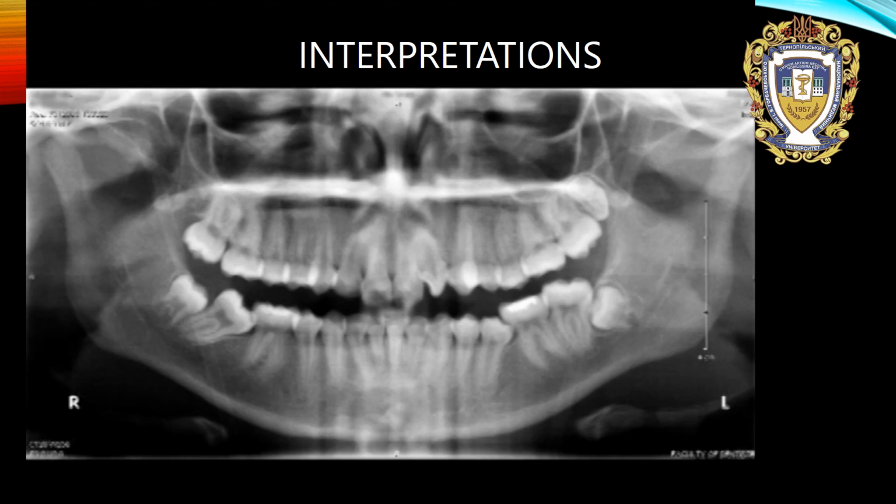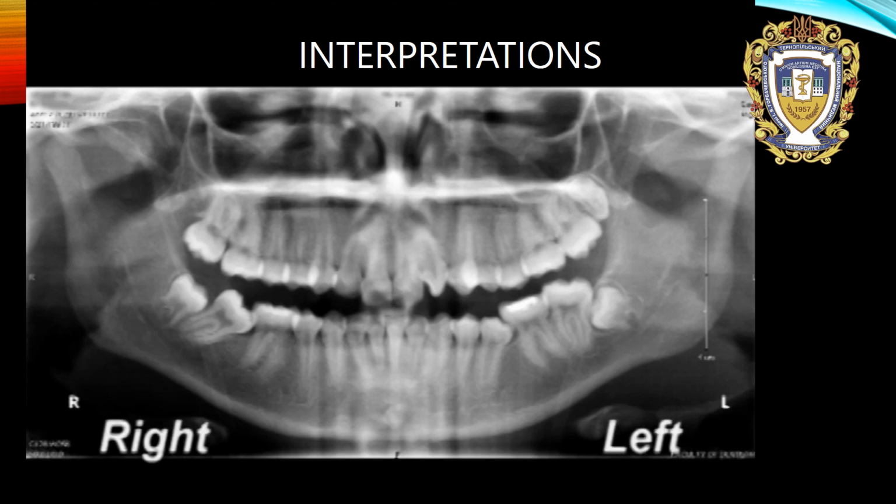Therefore, much more time will be spent doing this part of the interpretation. It is critical to have a good understanding of the normal anatomy in order to identify the presence of any abnormalities. It is useful to compare the left and right sides of the image when deciding if a finding is normal, since structures appearing bilaterally are generally anatomic. Comparing the left and right sides should also be done in order to detect any asymmetries that may be indicative of pathology or a developmental condition.